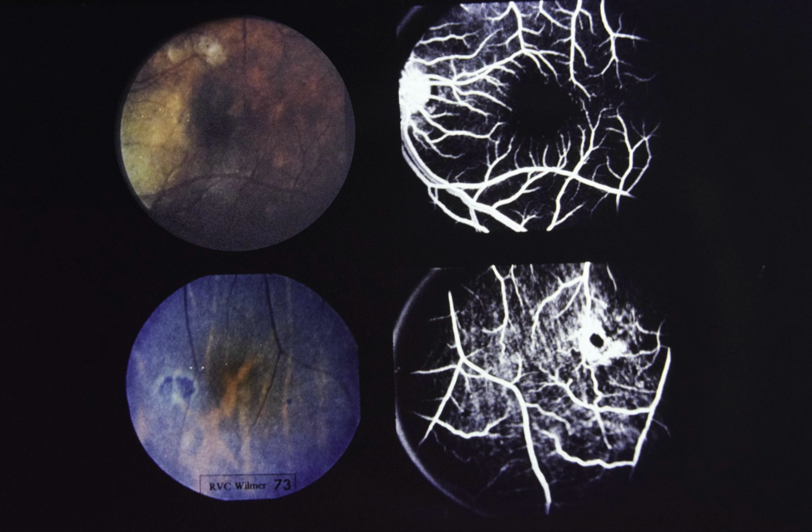Comment: the patient shown above sustained an ischemic infarct in the macula. Goldberg has shown that patients with hemoglobin SS undergo frequent remodeling of the retinal vascular architecture. Prolonged loss of central capillary perfusion, however, usually causes irreversible loss of central vision.